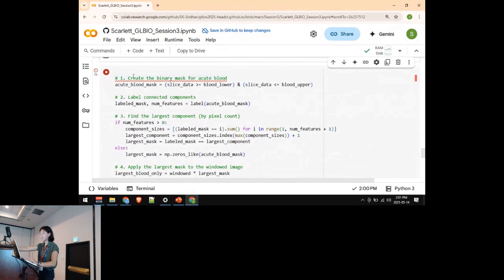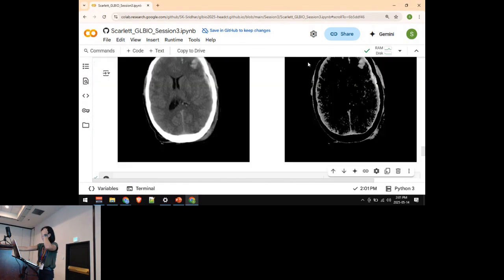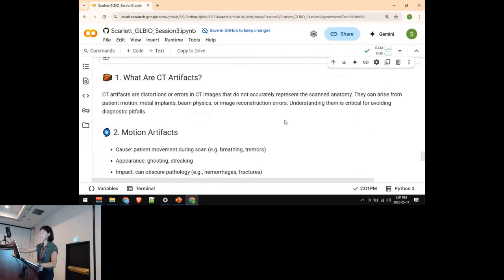And then here, so here I take a while. So above here, you can see this is the outside. The outside is actually our scalp. So you can still see a lake, because I just took the skull away. I didn't take the scalp away. So over here, you write another code, only keep the largest island. That's how you do basic segmentation.